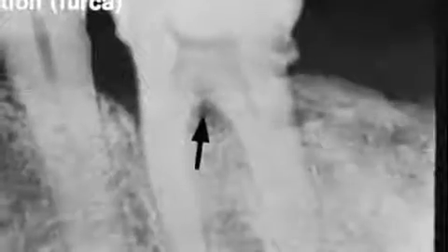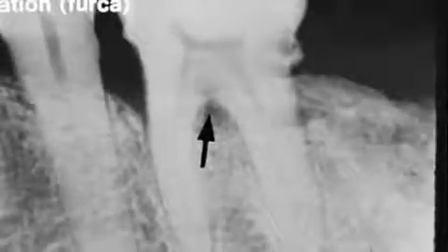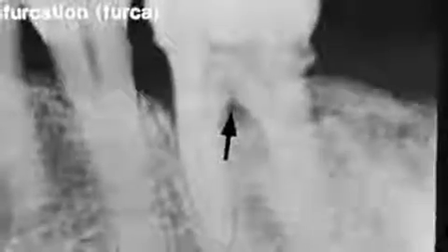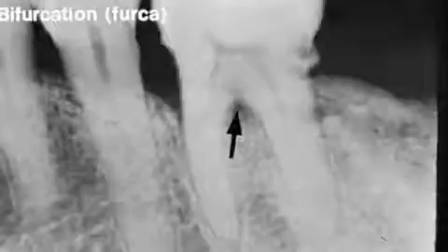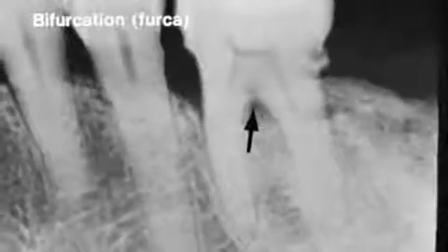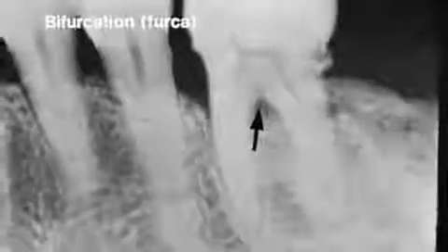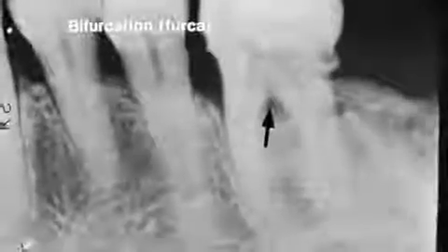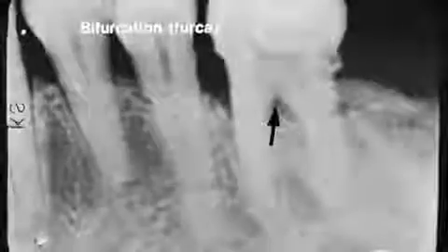Furcation involvement is bone loss in the area of the furcation of the roots and appears radiolucent. Notice that this is the slide we originally saw with calculus. What type of bone loss is on the mesial of number 19? How would you identify the bone change between the premolars, 20 and 21? Notice the X from the vertical changes of buccal and lingual bone between 21 and 22.